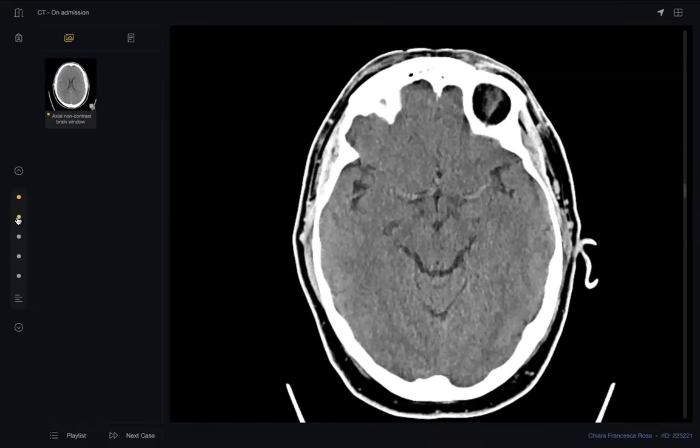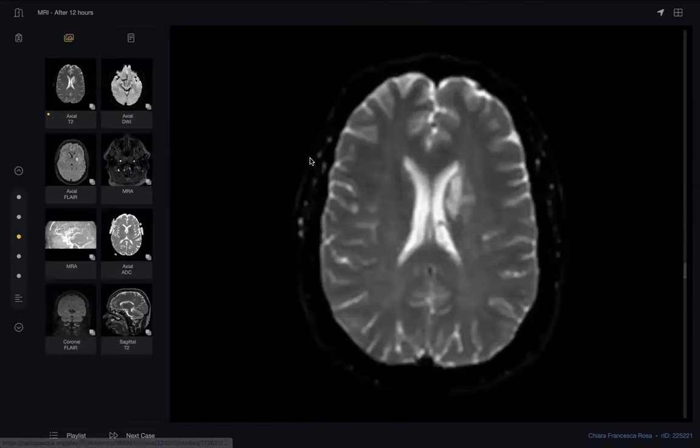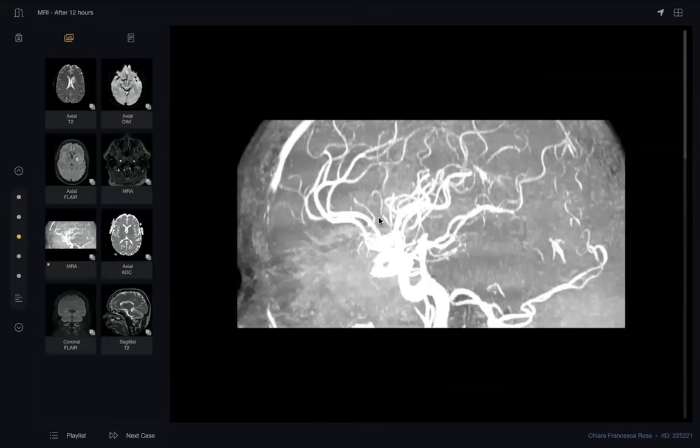He asked us to do this MRI. Okay, you did very well. This is MRA. What is the next exam after? If the examiner asks you about this patient, you did MRI and MRA brain. What else? Next step. I'm not talking about management. This patient sure must be managed very urgently. But about investigation, carotid Doppler.